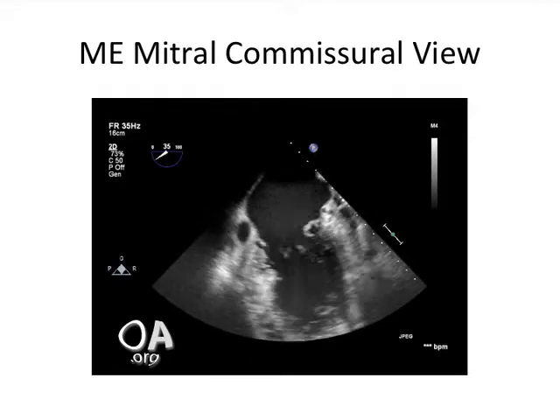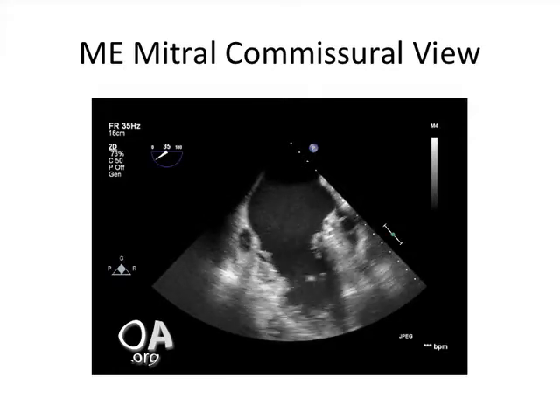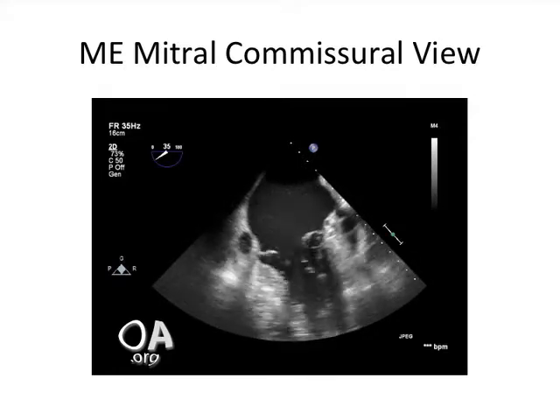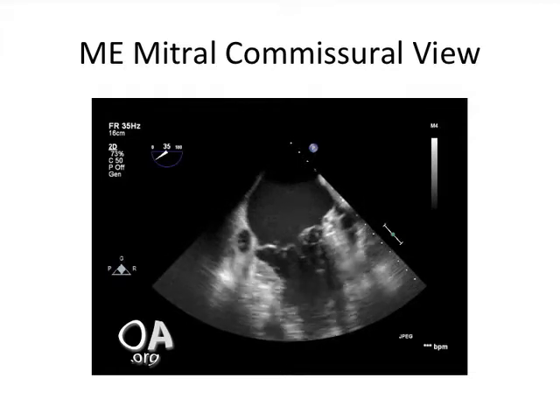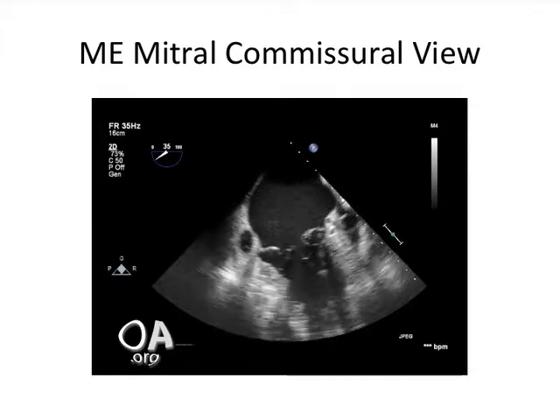Another noteworthy aspect of this TEE image is the dilation of the left atrium in this patient. One of the consequences of long-standing mitral regurgitation is that the left atrium becomes dilated due to the increased blood flow into that receiving chamber.